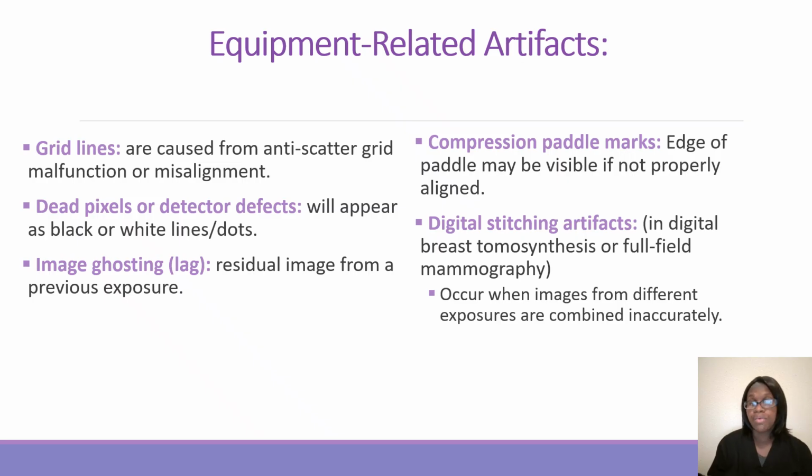Now we have our equipment related artifacts. So we have our grid lines, which are caused from anti-scatter grid malfunction or misalignment. You also have your dead pixels or detector defects. I have seen this several times before. This will appear as black or white lines or dots.